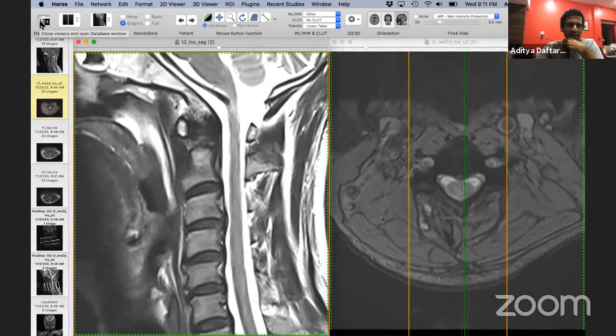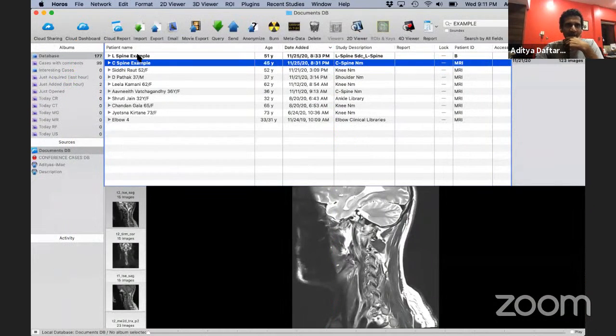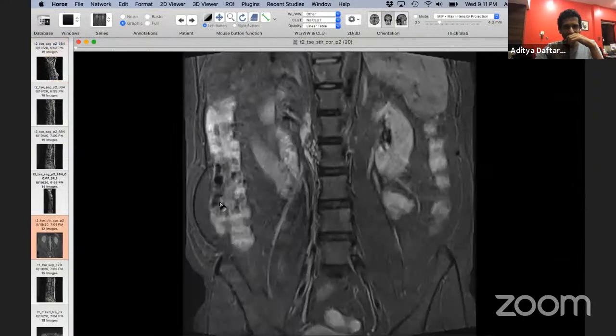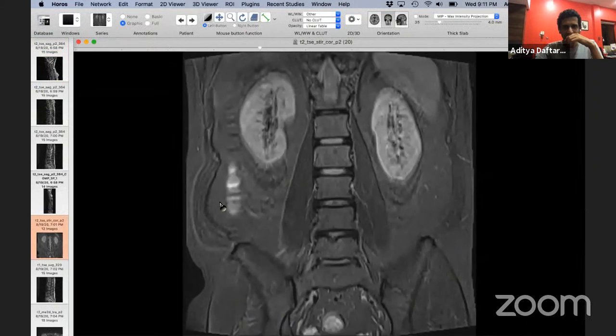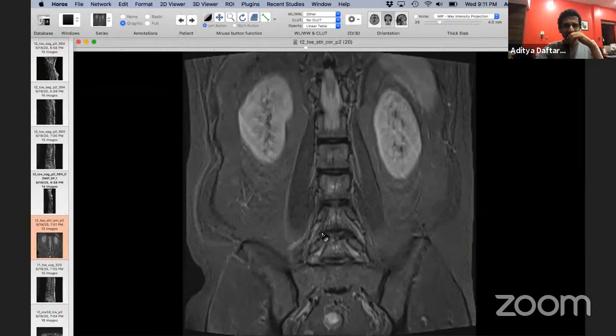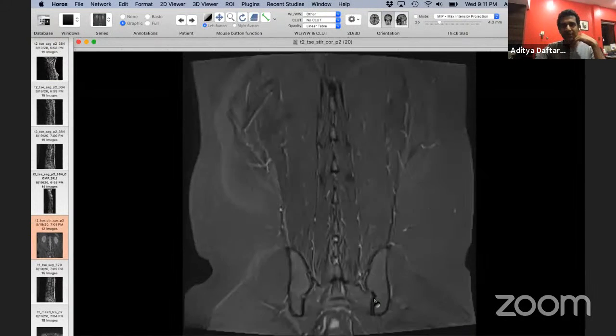In the interest of time, I'm going to move on with looking at a lumbar spine MR. And when we look at the lumbar spine MR, we have essentially the same thing. We have a coronal STIR sequence where you can look for bone edema, especially posteriorly when you have perifacet edema or sometimes cysts. You always get a good look at the sacroiliac joints. So when you're thinking about inflammatory arthropathy, always remember to look at the sacroiliac joints.